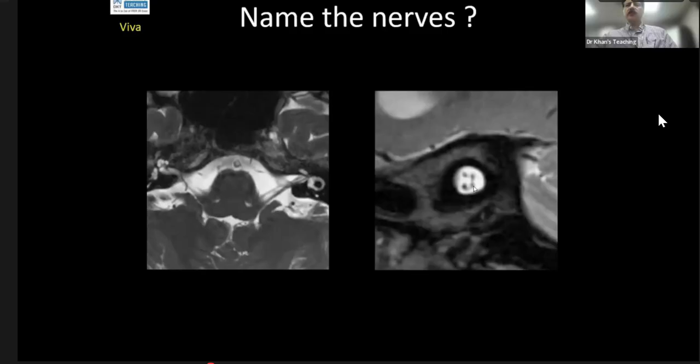Okay, so what is this nerve? That's the eighth nerve. Which nerve? Name the name. Vestibular cochlear nerve. No, my question is, you see this is the lateral most portion and you are seeing 4 nerves. Which one is this? Vestibular nerve.